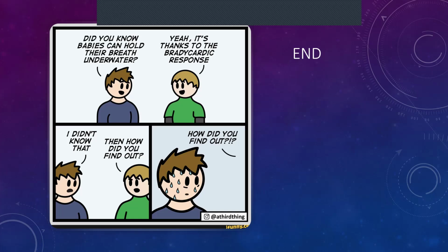I don't think there's anything that I forgot to mention. I'm hoping to discuss hypokalemia with you guys one of the days, and just different electrolyte imbalances and how they affect the ECG. But hyperkalemia is one of the easiest things to pick up on an ECG, and it can really save your patient's life. And you can start treating hyperkalemia before you've even got blood results, based just on the ECG.